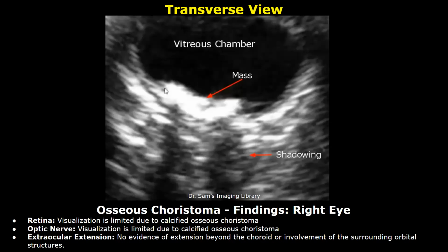Visualization of retina is limited due to the calcified osseous choristoma. The visualization of optic nerve is also limited. There is no evidence of extraocular extension.